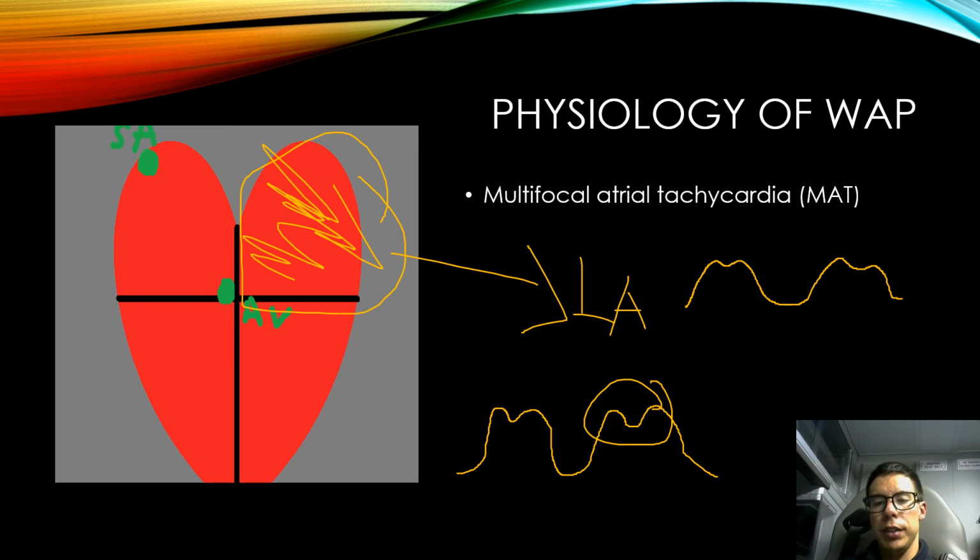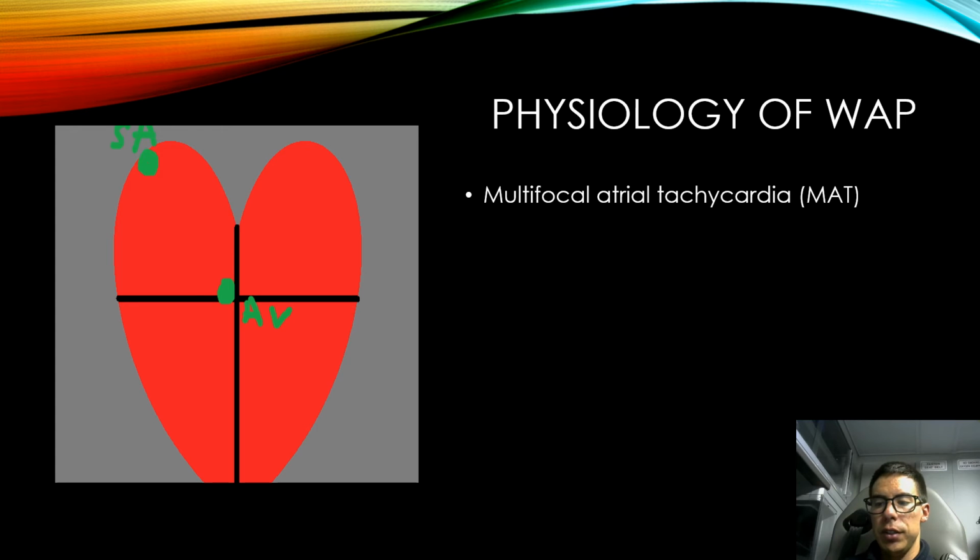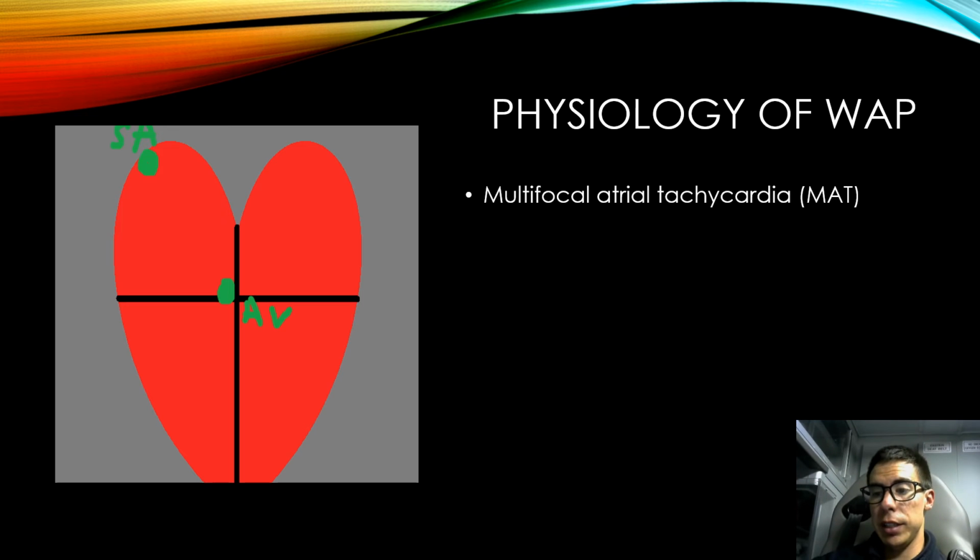And that's usually left atrium P waves, are kind of like that, but there can be all kinds of variations and different morphologies to those. But those are just somewhat more common that you might see, especially in a certain condition called hypertrophy of the atria, which we'll talk about in the advanced EKG lesson. But it can be any type of morphology. Just know that the M-ish shape is more left, and the tall, peaked, narrower ones are more right-sided atrial rhythms or atrial P waves.